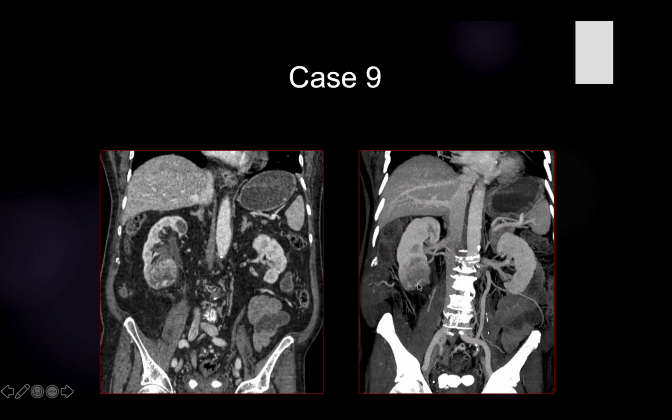This is called neoangiogenesis, which is characteristic of the neoplastic nature of the lesion here in renal cell carcinoma. So this angiogenesis is very, very important. This presence of abnormal vessel enlargement is called angiogenesis or new vascularization that is seen in malignant lesions, especially renal cell carcinoma, and one of the important features of renal cell carcinoma is the presence of these abnormal vessels. So this is an example of right lower pole renal cell carcinoma.